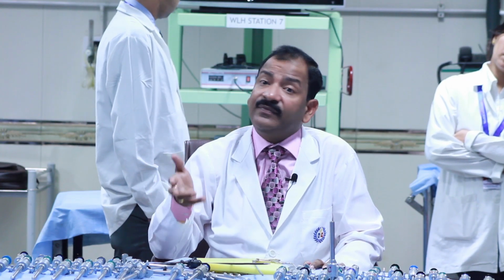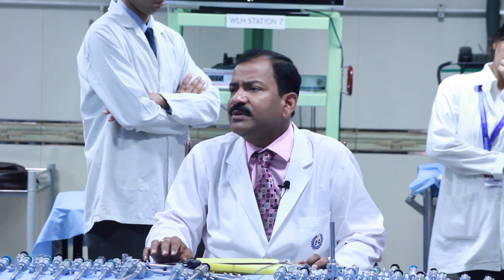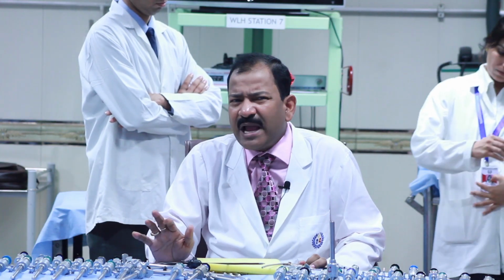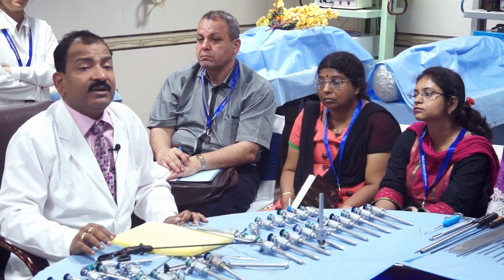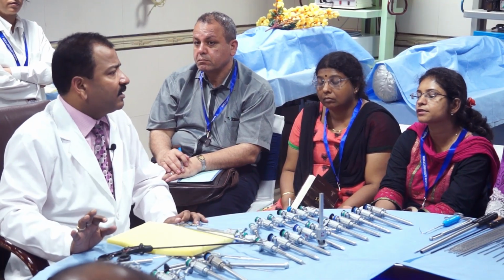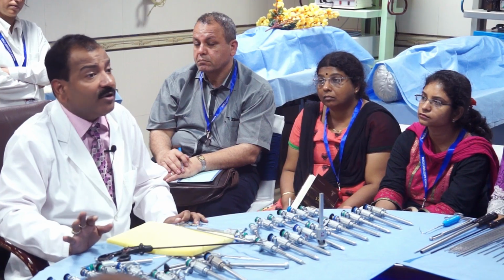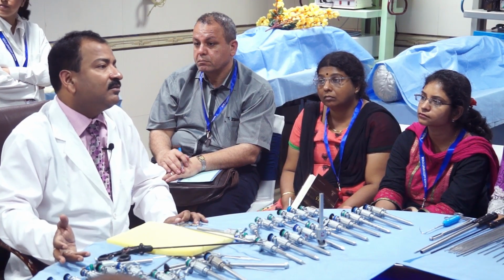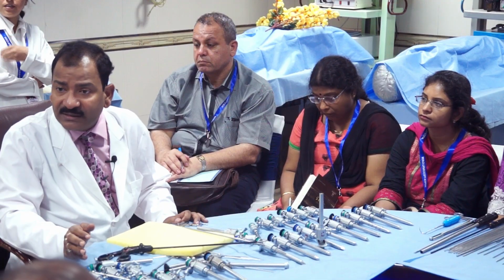This also makes a difference from surgeon to surgeon. So whenever we do something wrong in laparoscopy and we are not happy with our surgery, then we should think where I have gone wrong in the ergonomics, and you should try to learn it. It is not due to your problem, it is a problem of ergonomics only. You may be very good. If you rethink and next time do not do this, then your problem is solved. Or you ask, or you see the book for what they say about ergonomics.